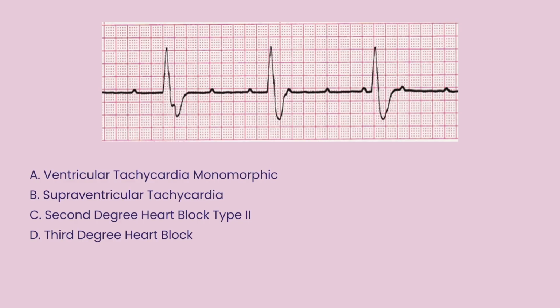Alrighty. What do we see? Well, we see our QRS is wide, okay? And when we look at our P to QRS ratio, let's map out our P waves here. We've got a P wave there. This is a P wave. It's buried in the QRS complex. P wave, boom, boom, boom, boom, and boom. Okay, so our P to P is pretty regular throughout overall. And our QRS to QRS is pretty regular throughout, right? But doesn't look like they're talking to one another.